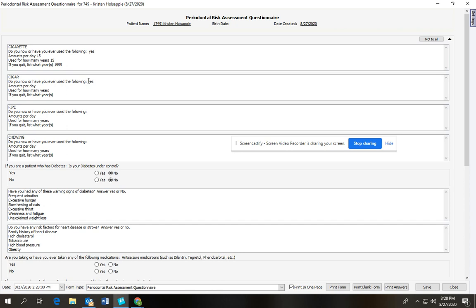Then I'm going to come down here. Amounts per day, 2. How many years? 2. I'm just making stuff up. Pipe, same thing. Chewing, same thing.